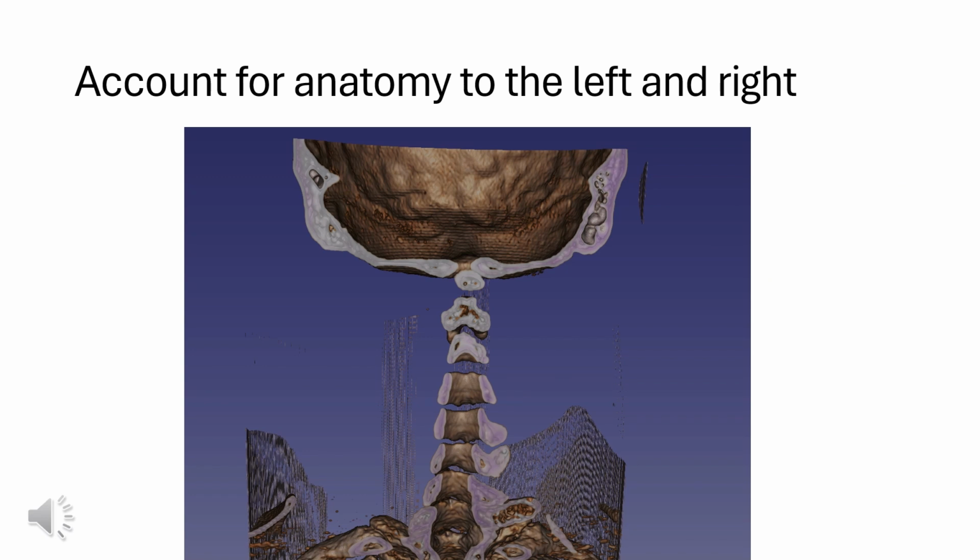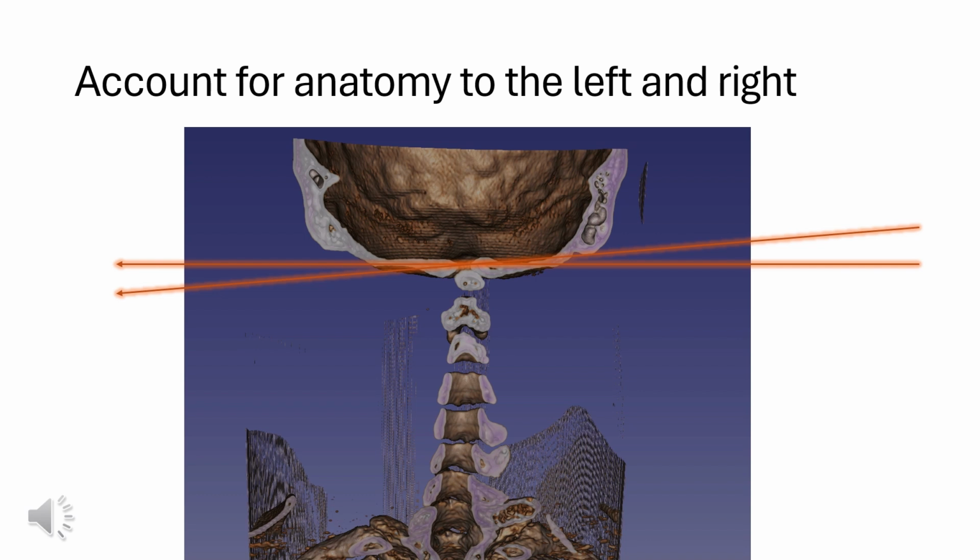Here is a three-dimensional view of the region of the opisthion, with all the anatomy in front of the opisthion removed. This also helps to appreciate all of the anatomy to the left and right of the opisthion that will appear in the X-ray, and the appearance will change depending on the path of the X-ray through the anatomy. In finding the opisthion, you will see the radiographic features of the skull base to the left and right of the opisthion. Knowing that can be useful if the X-ray beam is not parallel to the skull base.